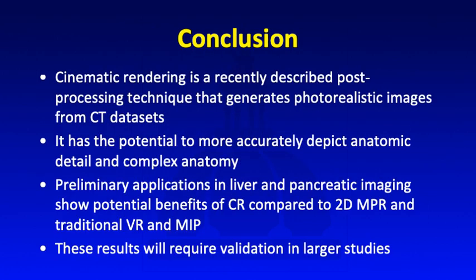In conclusion, cinematic rendering is a recently described post-processing technique that generates photorealistic images from CT datasets. It has the potential to more accurately depict anatomic detail and complex anatomy. Preliminary applications in liver and pancreatic imaging show potential benefits of CR compared to 2D MPR and traditional VR and MIP imaging. These results will require validation in larger studies.